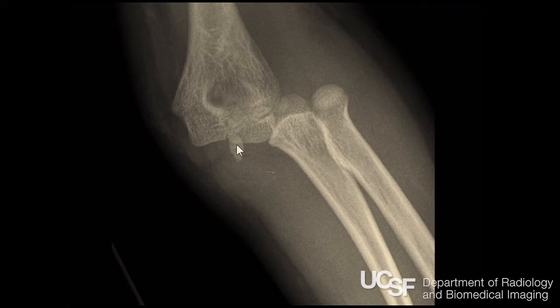Well, they're not old enough to have a 10. That actually is the 7. That's the medial epicondyle that got taken with the radius and ulna when the elbow dislocated. So that's how we got that.